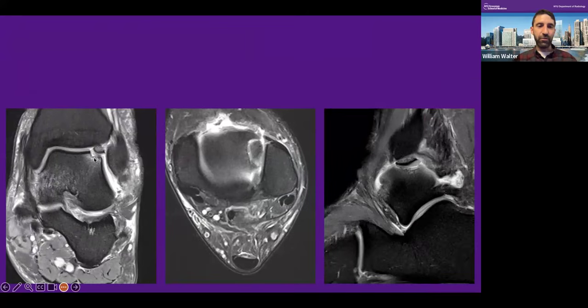Here at the lateral talar dome, MRI is confirming that there is a notch of bone missing from the talar dome articular surface. This is the little piece of bone that we were seeing on the X-ray. And you'll notice as you trace along the articular surfaces, there's intact cartilage. That's the gray stripe here. The black stripe is the bone of the subchondral bone plate. And then the rest is the internal bone marrow of the cancellous bone.